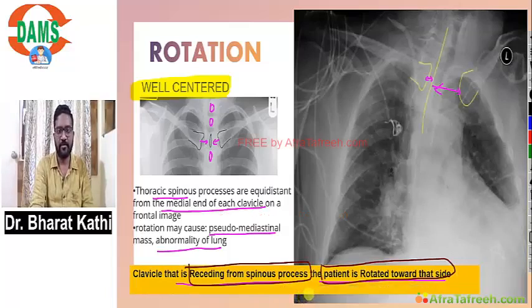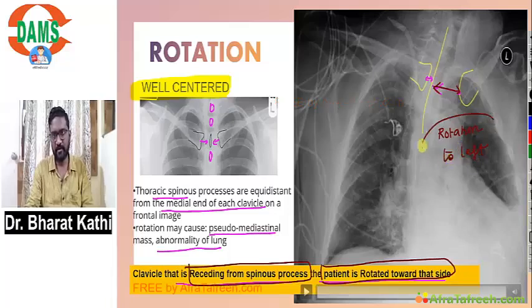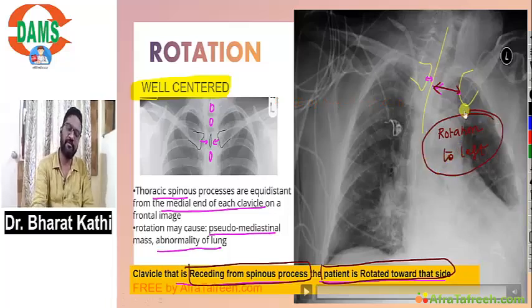You can notice here, because the patient's clavicle is far away here, to that side the patient is rotated. So it is rotation to the left. The patient is rotated to the left.